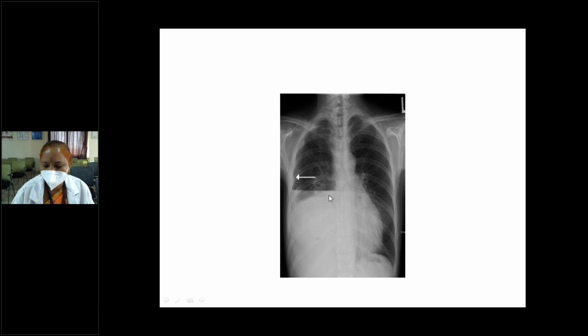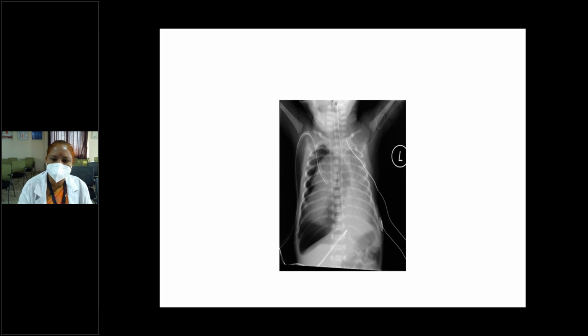Roll number 80. Present or absent? Present, ma'am. Can you read this chest X-ray? It is a plain X-ray of the chest and the upper abdomen, ma'am. Taken in the PA view. Not PA view. You are able to see AP view. Spines and intervertebral spaces also, from down here up to even the sacral region also you're able to see. So if the spines and vertebral discs are clearly visible, it's always an AP view. That too, infants usually will be taken in AP view in lying down, supine position. Okay. Yes, ma'am.